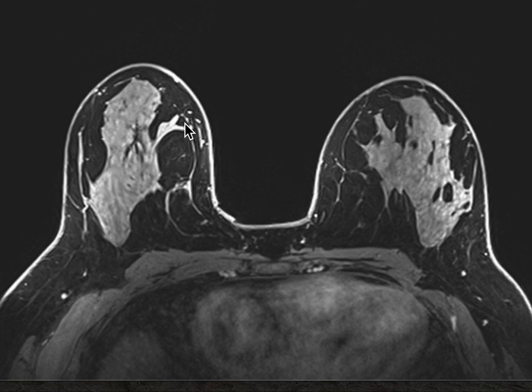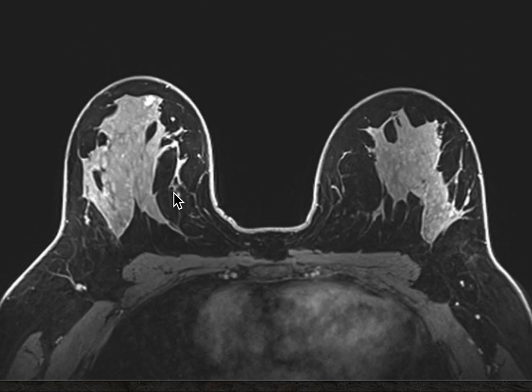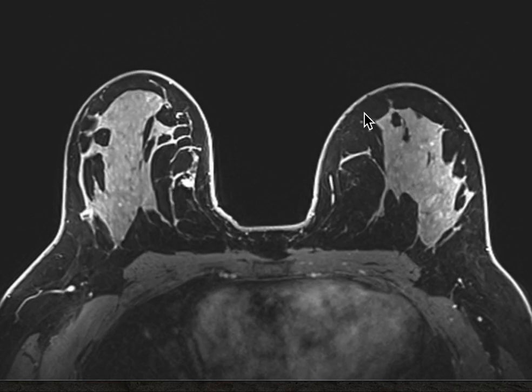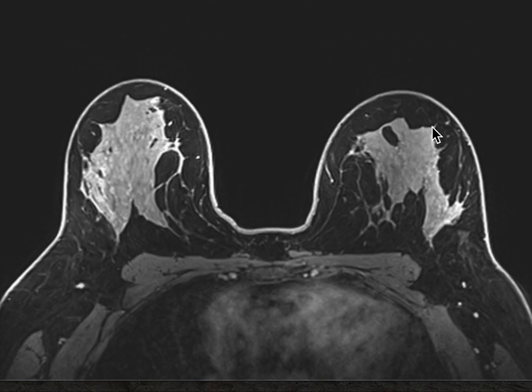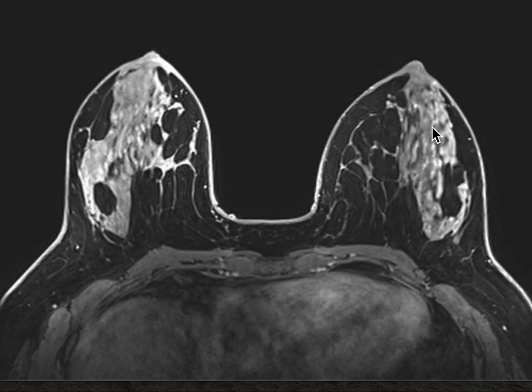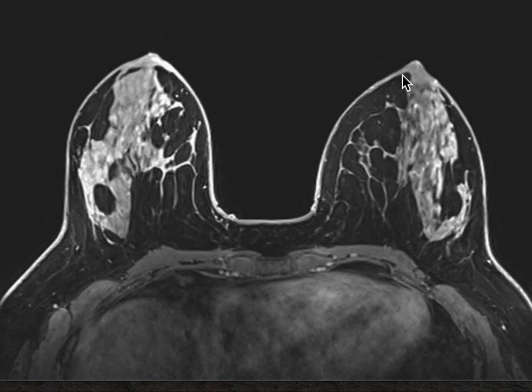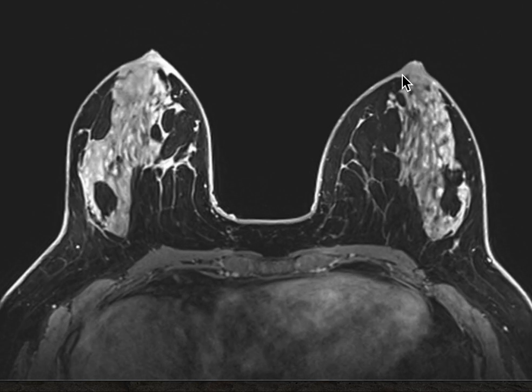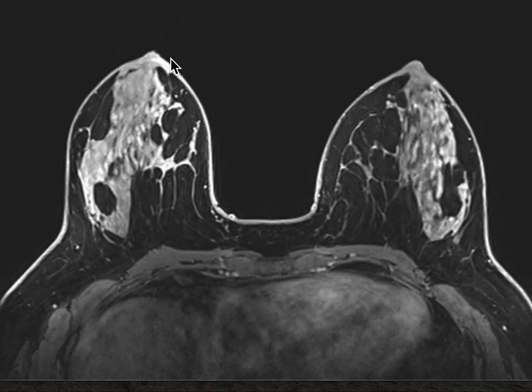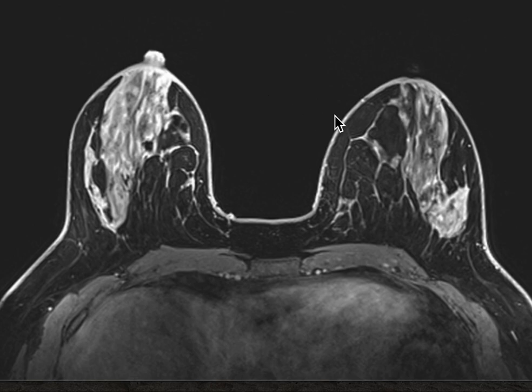When going through them, I usually just go in order. I'll look at the right breast, go all the way through, then go to the left breast all the way through. And remember, the nipples enhance. When you see enhancement in the nipples, that is normal, but you want to look for asymmetry in terms of nipple enhancement. It's not necessarily going to be on the same image, because not everyone is symmetrical. Actually, most people are not symmetrical.